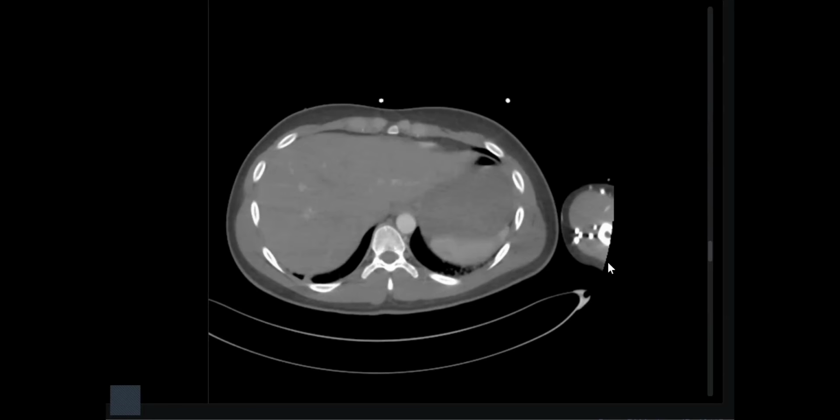So the aorta appears unremarkable in outline. There is a hematoma in the thorax. Mediastinal hematoma is noted. The obvious finding is a focal mediastinal hematoma in the upper mediastinum, with lung contusions. I would like to see the lung window for this and the bone window for detailed evaluation of fractures in this case.